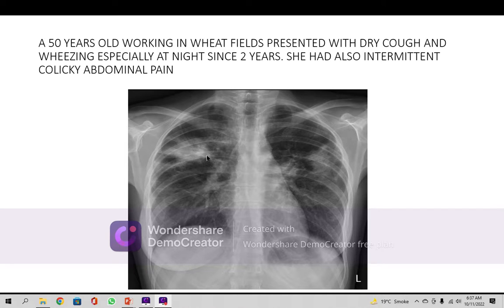It has an elliptical type of shape. And down there the bronchovascular markings are thick, and they are touching the lateral wall of the hemithorax up to one third. On the other side again the same type of reaction is seen. Is this homogeneous or not homogeneous? On the left side, same findings. And the costophrenic angle of this side and this side is normal.